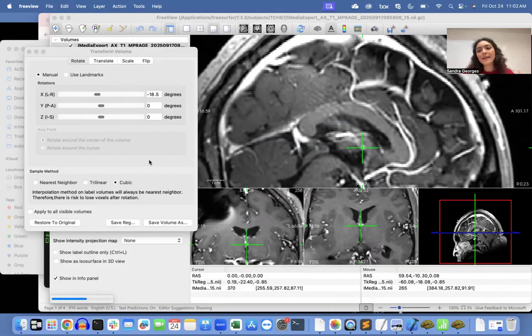So the next thing that we're going to look at is the eyes. That will help us also see if the scan is coming in too early from the left hemisphere, right hemisphere, for example, and it'll just give us a better alignment, pretty much. So gonna wait for this to be saved, and we will zoom out and try again.